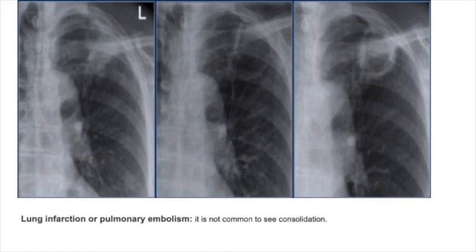And this is a sample of infarction or pulmonary embolism. It's very common here in Ghana to treat these kinds of diseases, even though they are very uncommon. When any patient arrives to the emergency room, they want to treat cardiac infarction or embolism at the same time.